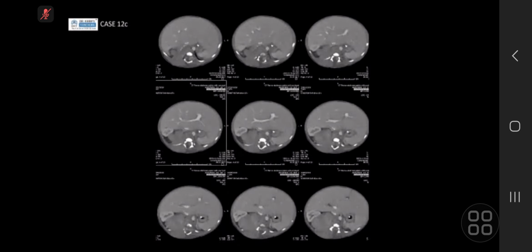So the epicenter of the lesion is in the right paravertebral region, probably involving the right adrenal gland with intraspinal extension. In a 7-day-old, my differentials will be a neuroblastoma, less likely a Wilms tumor as the kidney is pushed anteriorly, and less likely a lymphoma as the age group does not fit. Is the patient having any other symptoms?